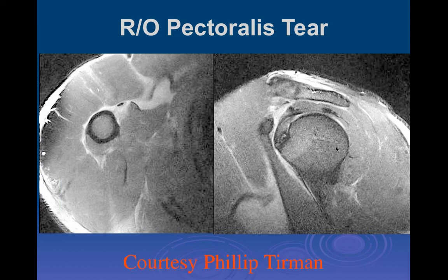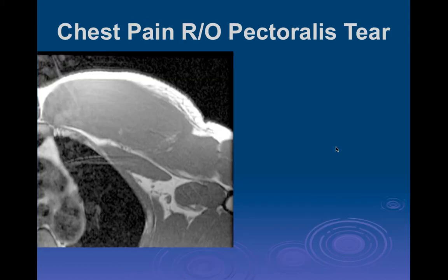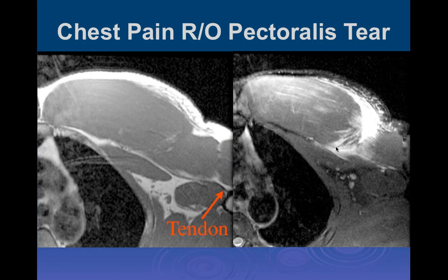Cruz. Yes. What do you do with myotendinous if it's torn at the myotendinous junction? What's the treatment? At the myotendinous junction, what's important is to look at the quality of the tendon at the musculo-tendinous junction. If there's a substantial nubbin of low signal intensity fibrous tissue there, then it may be surgical. The surgeon may want to go in and evaluate whether they can repair it or not.